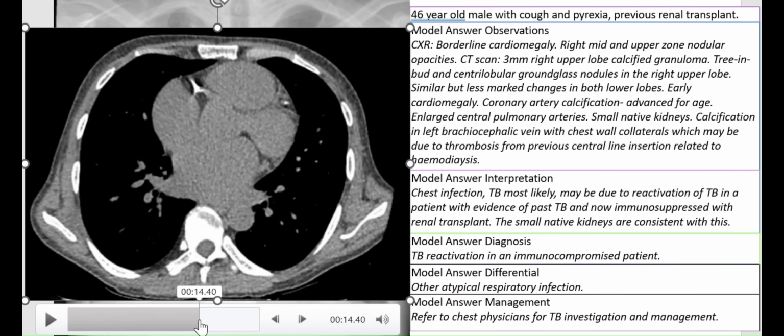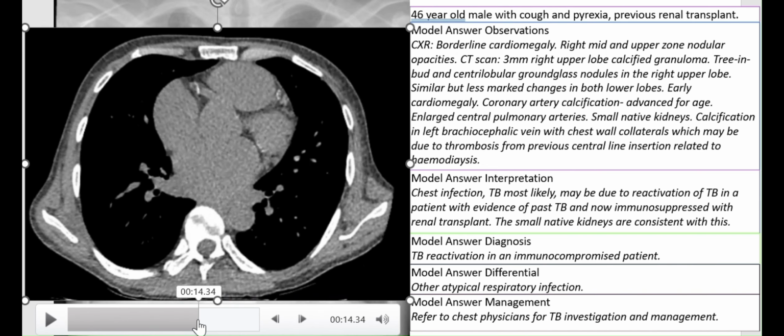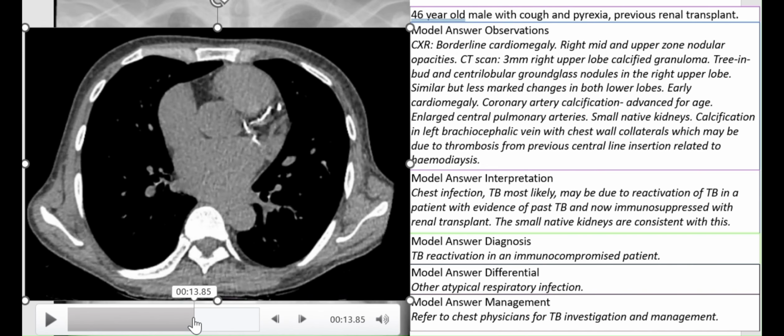There's calcification of the right coronary artery, and the left coronary artery, after arising from the root of the aorta, gives the left anterior descending, and it's calcified, and the left circumflex coronary artery is also calcified.